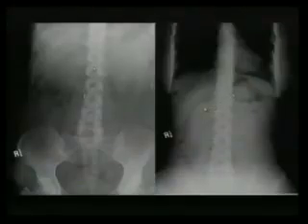The erect view, what we do on an erect view, we're looking for air fluid levels. We're looking for free air under the hemidiaphragms. That's the important part of the erect view. I always start with the bones. I always go spinous process, spinous process. If there was a laminectomy, you would go spine, spine, spine, spine. Where's the other spine? You see a blackness here and you'd recognize it as a laminectomy. If you don't really look at a systematic approach, you can miss a lot of things.